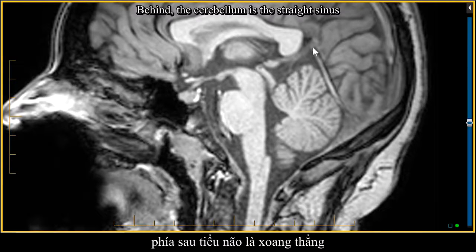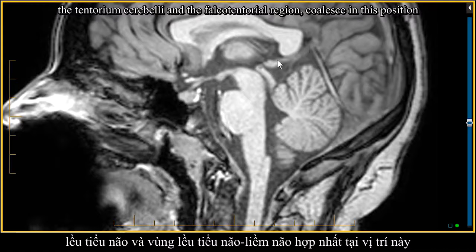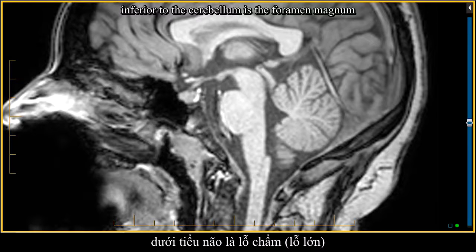Behind the cerebellum is the straight sinus, and above it the vein of Galen. The tentorium cerebelli and the falcotentorial region coalesce in this position. Inferior to the cerebellum is the foramen magnum.